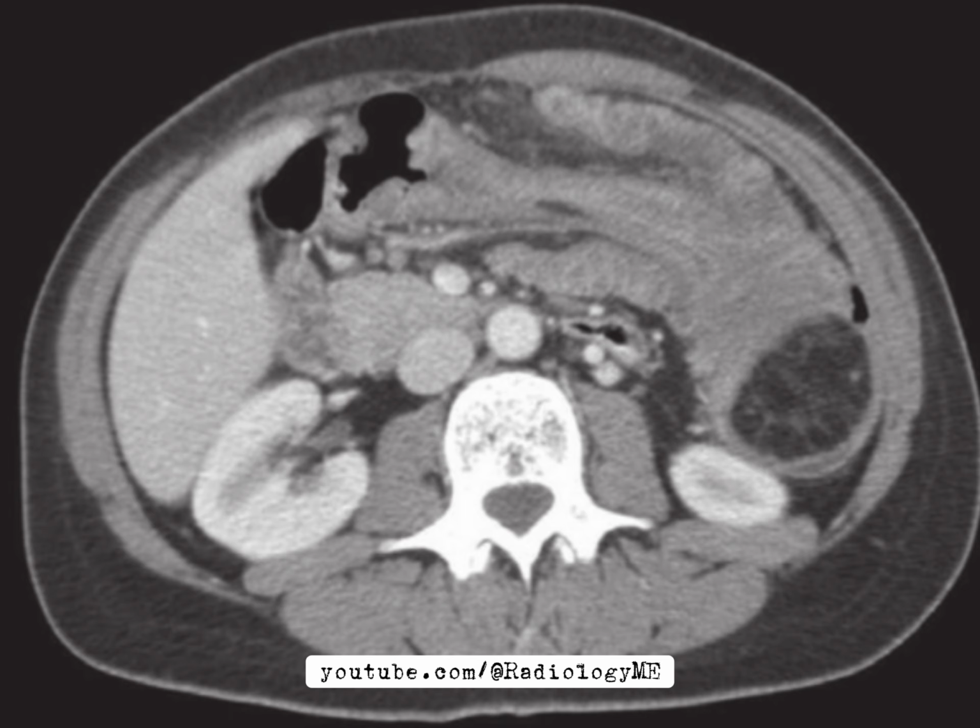And finally, just to round things off, small bowel intussusception can often be challenging to diagnose early because the symptoms can mimic so many other conditions. But thanks to modern imaging modalities like CT, we can often catch these cases early enough to intervene before complications develop. Surgical intervention, while necessary, tends to have a good prognosis, especially when the cause is benign, like a lipoma.